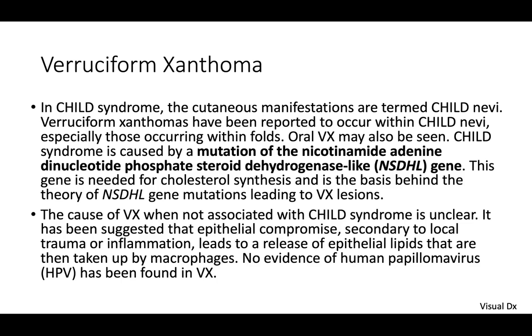So again, this is not your classic verruciform lesion. This is not your classic verruca vulgaris. This is a xanthoma that takes on a verruciform architecture.